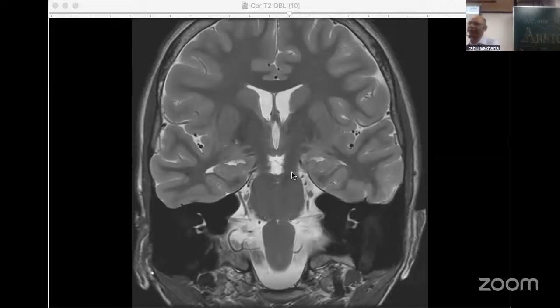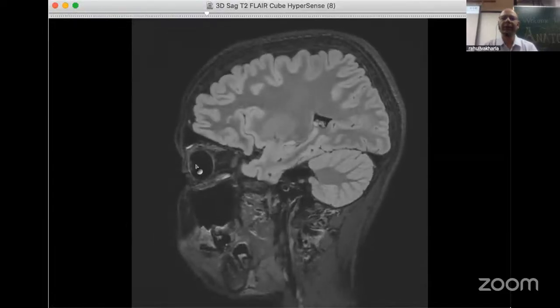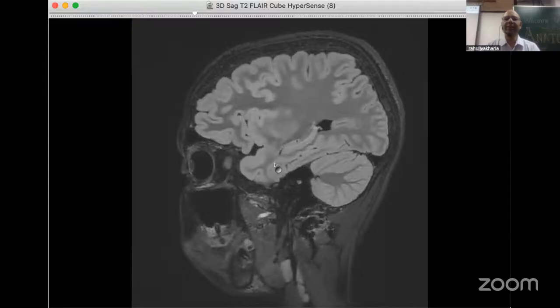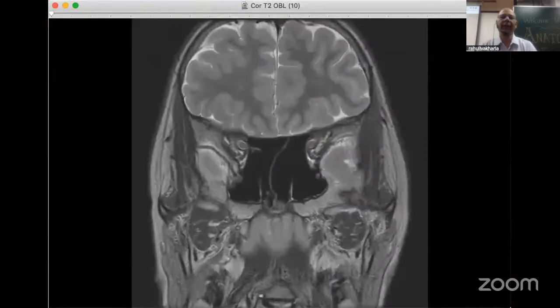It's not straight coronal, it is oblique coronal, perpendicular to the, so let me tell you. In the sagittal plane, what we are seeing is the hippocampus. So the way we acquire is in this direction, perpendicular to the hippocampus, and that will give us the precise anatomy on the coronal plane.